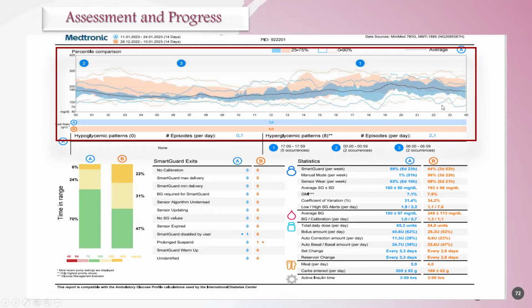That means if you see there are slight lines here for the blood sugar values, it's not clear on this screen, but he's hovering around these lines. Okay, so he's within this range. And looking at the periods of time, he has some sort of hump here, maybe small here, and maybe a little bit at night, high rest.